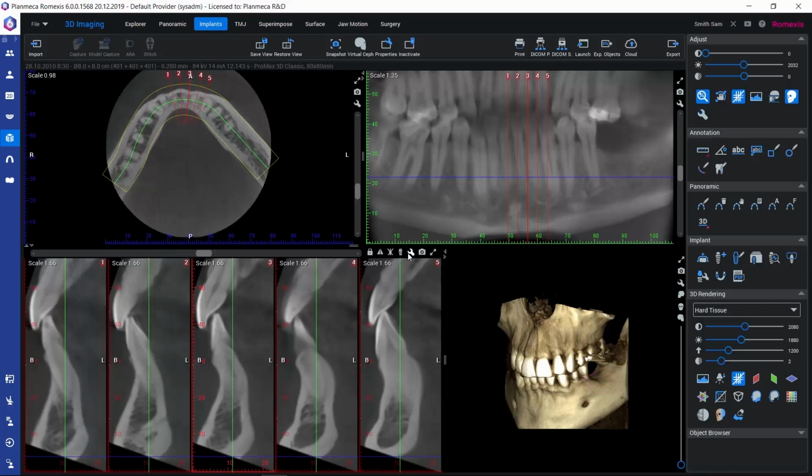These were the viewport settings, and then we have here also the snapshot function, so we could make a 2D image of this view that would be saved among the 2D images of the patient. And then we could maximize these cross-sections on the whole image viewing area.